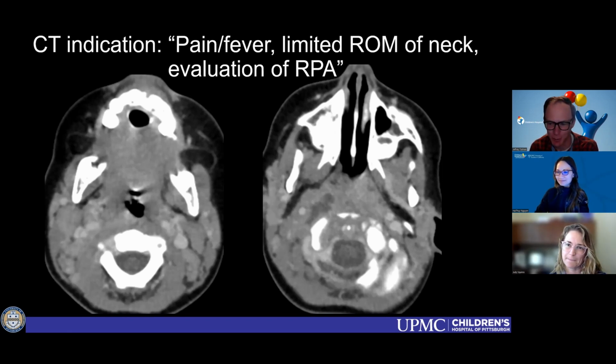We don't have it as part of our formal protocol. We actually had a really similar case not too long ago. I want to say a 16-month-old kid that came in with the same indication of cheek swelling, look for lymph nodes. And the sonographer that was scanning happened to have worked at a prior place where they did more tonsillar ultrasound than we do. And it's pretty easy to look if you just look at the submandibular glands and just look a little bit deeper. And the kid had an even bigger peritonsillar abscess than this one. And you could see it really beautifully on ultrasound.